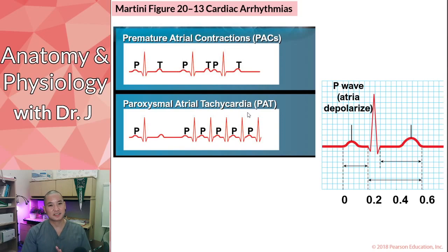Now it looks kind of scary and you're like, oh, T's running into P's, is that dangerous? Paroxysmal refers to almost like an outburst or a fit of something in medical terminology. So the good news is that even though this looks kind of scary, sometimes it appears and usually it resolves by itself. But if someone's having this pattern repeatedly when they didn't have it before, maybe they have to be monitored more and work with their cardiologist to see if there's some sort of underlying cause. But when this happens, it's not life-threatening most of the time. Usually it resolves itself.